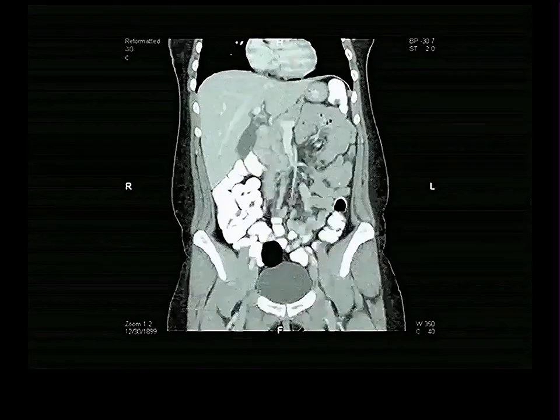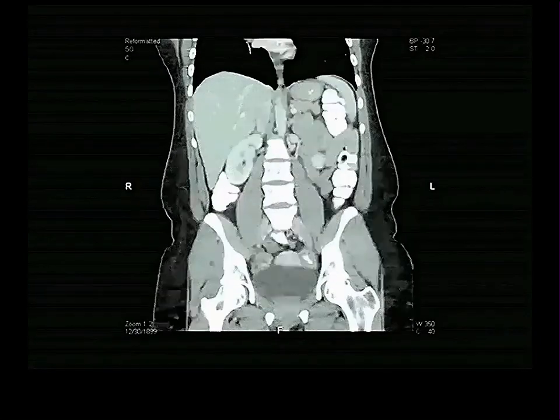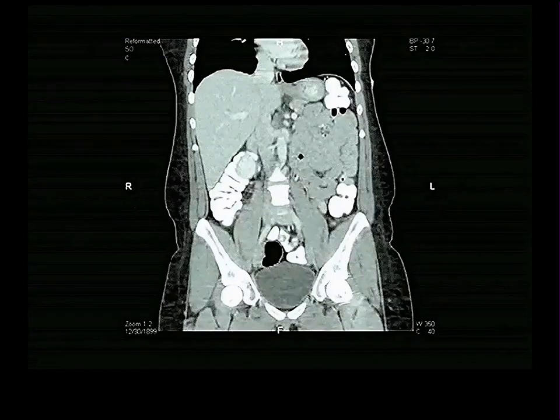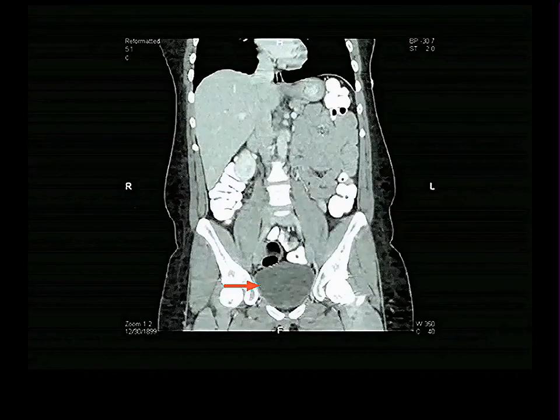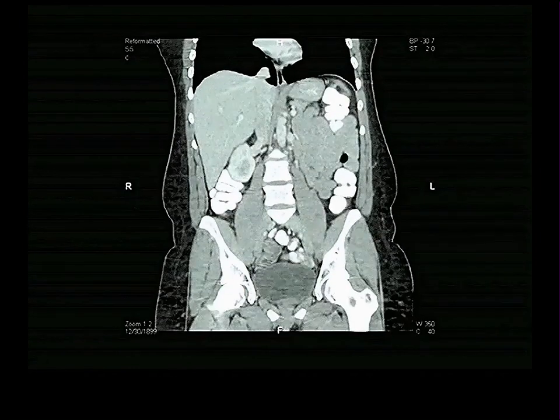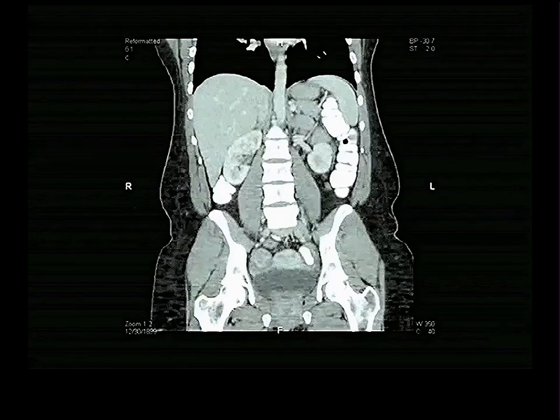And we're just going backward. I can't even remember which is backward. Forward. All right, let's go back and look at, here's our bladder. I got totally sidetracked by my ureter ovarian artery issue. Here's the bladder. We continue to go backwards. Here's the uterus, which in this person is sort of leaning over and sitting on top of the bladder. That's fine. We keep on going backwards.